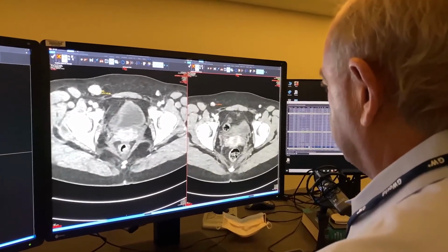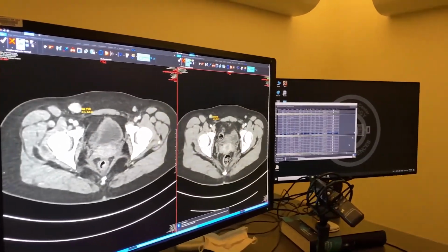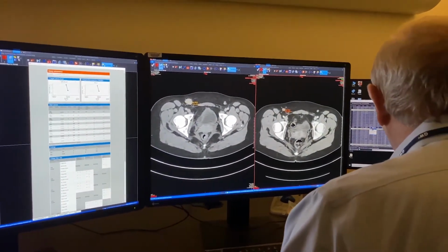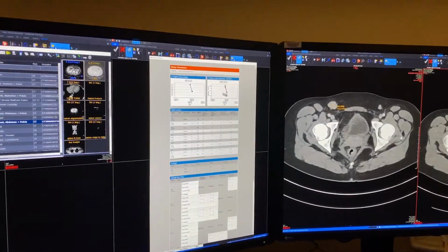And again, the machine would usually recognize it. There it did. So it automatically plotted these two with this F13. So now going to the chart, looking at 2 of these lesions, oh, and I have to make it a target lesion, just like I did before. And again, this is done in the background. So now both of these lesions, this is the total, and this is both of these lesions now getting smaller.